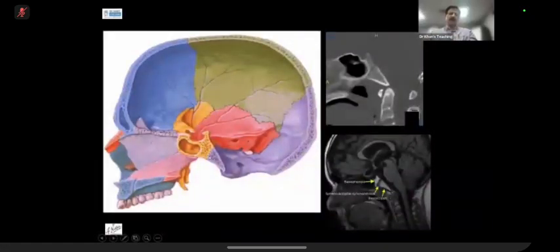Now, if you see here, this is your clivus. As I was telling you, the clivus is made up of two bones. One is the occipital bone, and this is the basisphenoid or the sphenoid bone. In a growing skeleton, there will be a synchondrosis there. There will be a joint, and this shows on a CT scan. So don't get confused. If you are doing an on-call report of a trauma in a child, don't get confused that this is a fracture line.